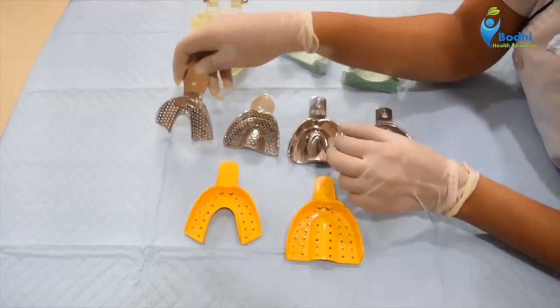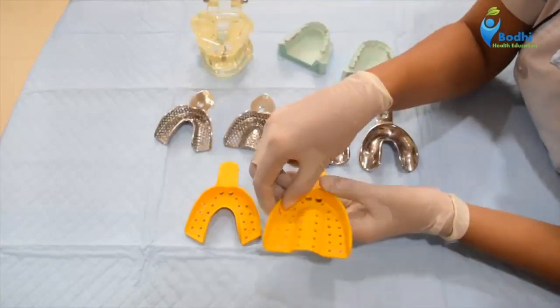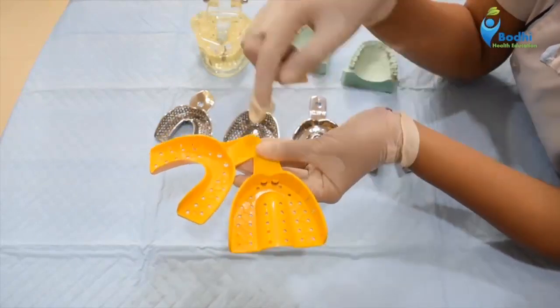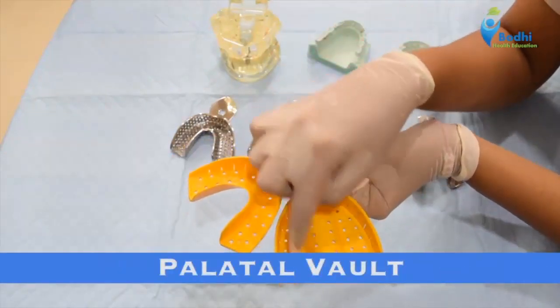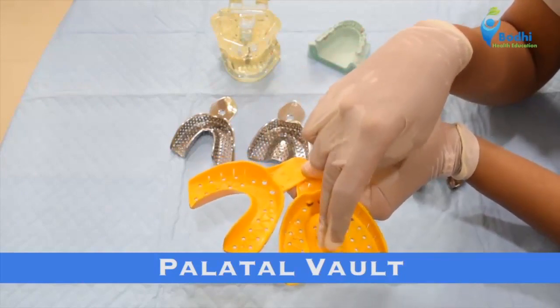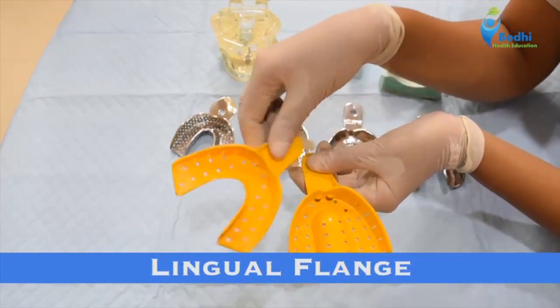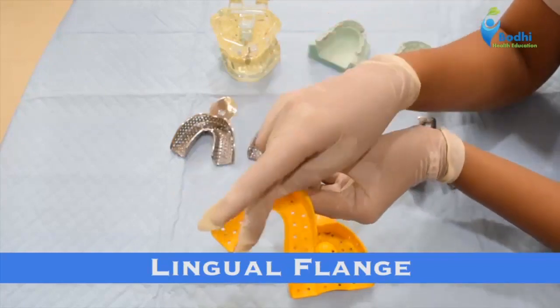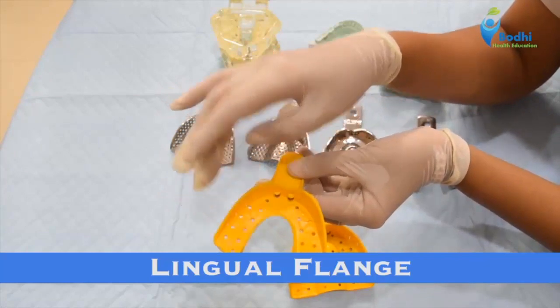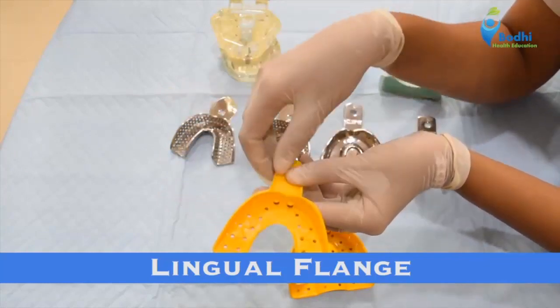So if you have to differentiate between the maxillary and the mandibular impression tray, it's very simple. Let me repeat it once again for you. The maxillary impression tray has got a palatal vault to record the palate in the maxilla or the upper jaw, whereas the mandibular impression tray has got the lingual flange area along with the labial flange and has not got any vault area.